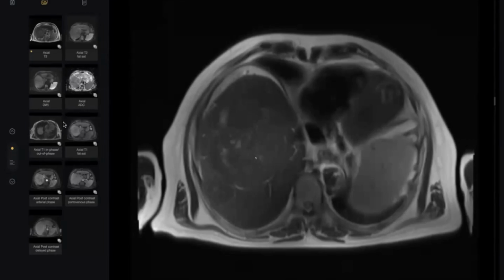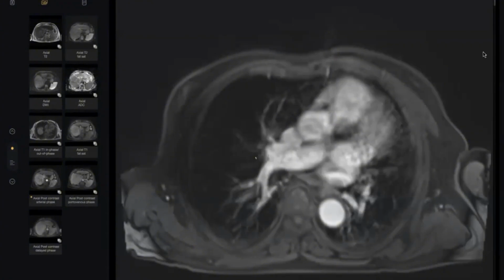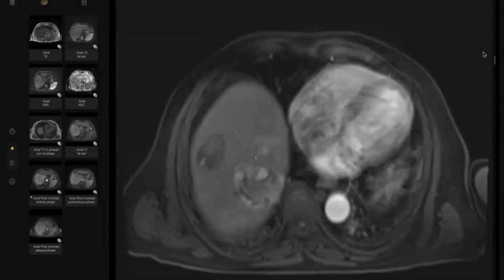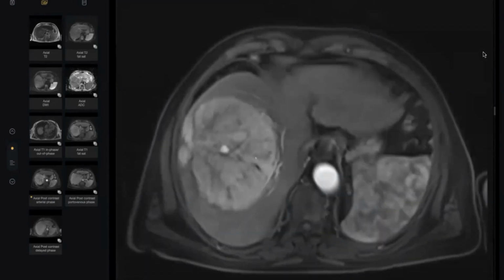Look here. This is post contrast. Okay, so this is T1 post-contrast, the fat saturated images. I'm trying to scroll again. Okay, so the hepatic dome lesions are heterogeneous with peripheral enhancement, but I would like to compare with the T1 non-contrast to confirm. Yes, confirm it. What else?